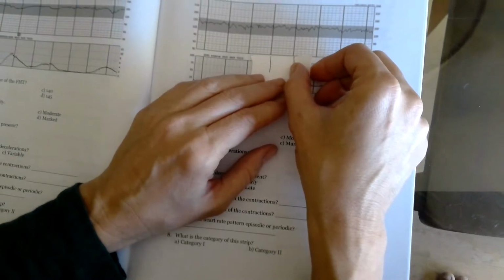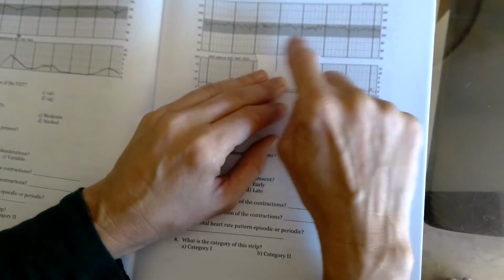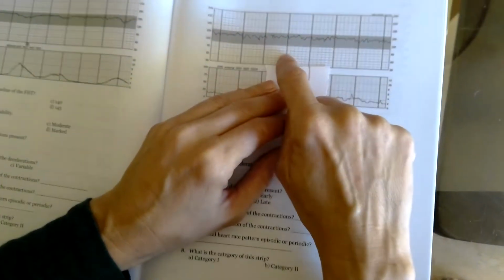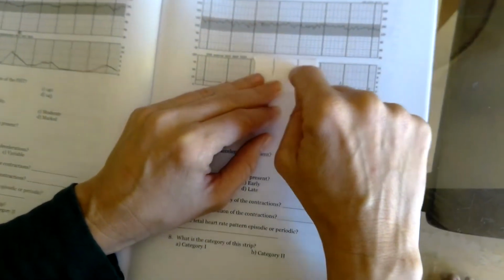Okay, guys, so I want you to take your piece of paper and just go to strip 5, and you can see where the bold lines are here. I just want you guys to draw these two lines to just further extend these bold lines. This way, we know here this is our perfect 60-second marker. So now we have a 60-second marker here on our paper. It's going to make it easier for us to be able to get the duration and frequency.